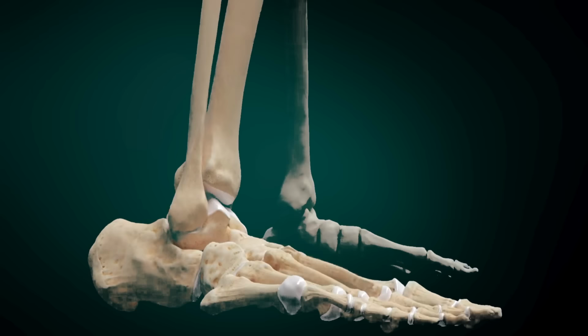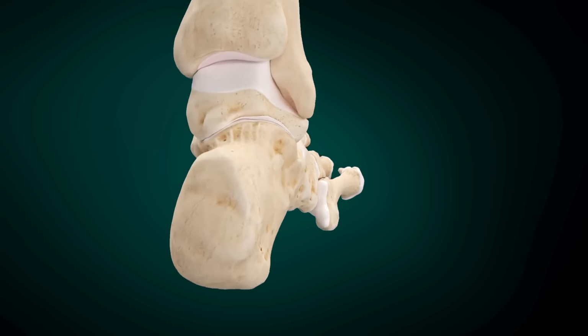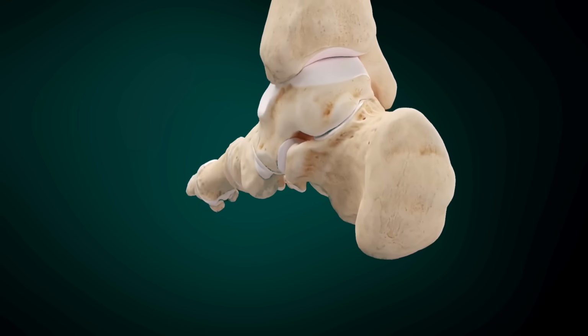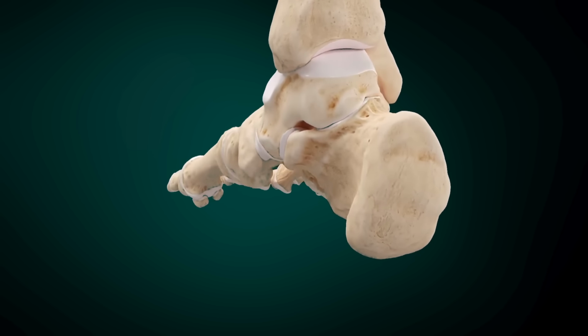Flatfoot is a disorder that involves multiple joints in the foot, but also the knee, hip, and potentially spine due to the change in static condition of the leg axis. A key element of the static changes in a flatfoot pathology is a hypereversion of the calcaneus with a medial drop of the sustentaculum tali, combined with an anterior translation of the talus over the calcaneus. The talus loses its plantar support and plantar flexes.